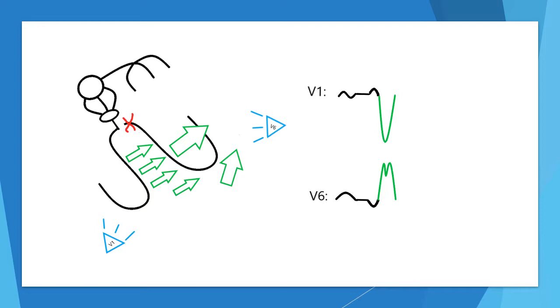And what's happening is you have cell-to-cell depolarization of the left ventricle, and it's abnormally conducted. So rather than using our conductive network, it basically uses a large portion of the cardiac myocytes. And because of that, you get this high amplitude QRS complex. So in V1, it's going to be a very deep S wave, and in V6, it can be a very tall upright QRS. Doesn't have to be, depending on the patient's physiology and underlying comorbidities.